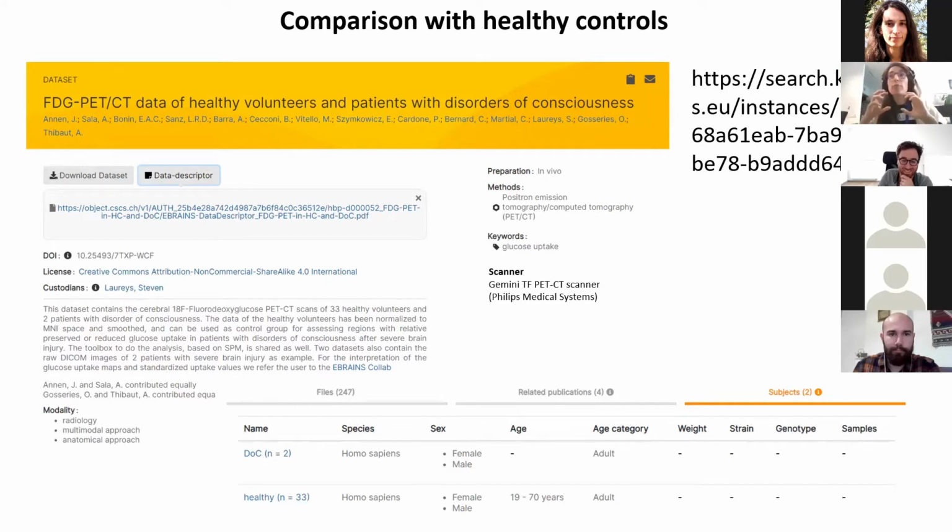It is true that these patients have very, very huge deformations in the brain and huge decreases in metabolism, but just be careful. Ideally, you would want to acquire your own group of healthy controls for all the statistical analysis you might ever do, whether it is disorders of consciousness, dementia, epilepsy, whatever.